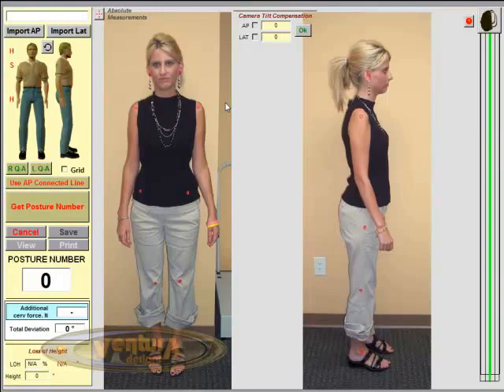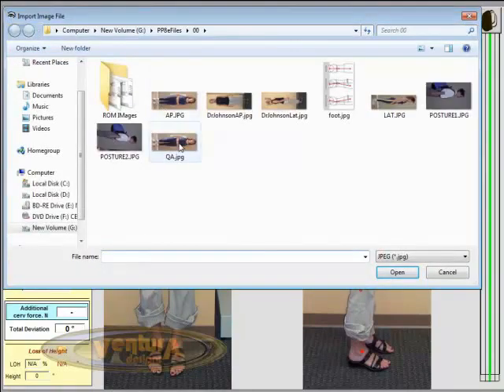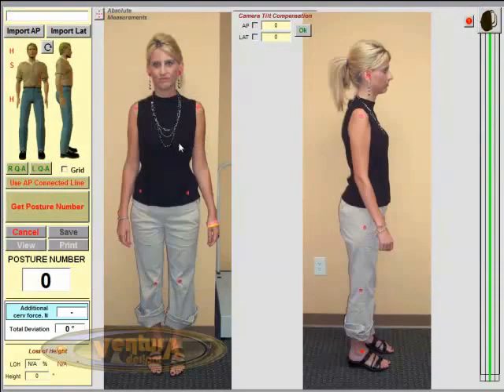I have one question. You talked a little bit about the Q angle, and just kind of looking more into that. How long does finding that usually take? It seems pretty fast on the other ones. I'm just curious if you look into the Q angle. I'll bring in a picture here that we can do a Q angle exam on.